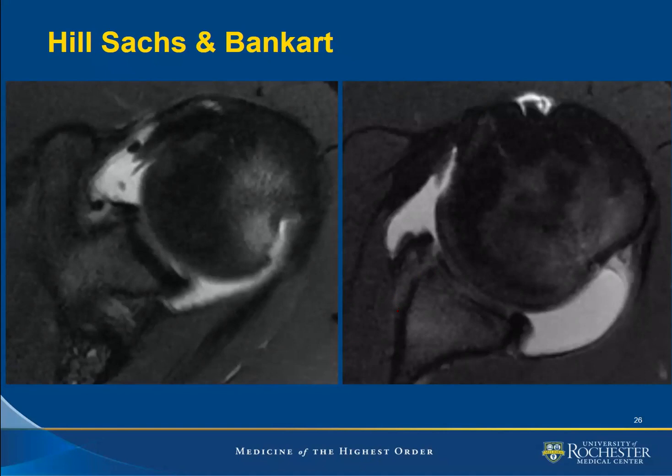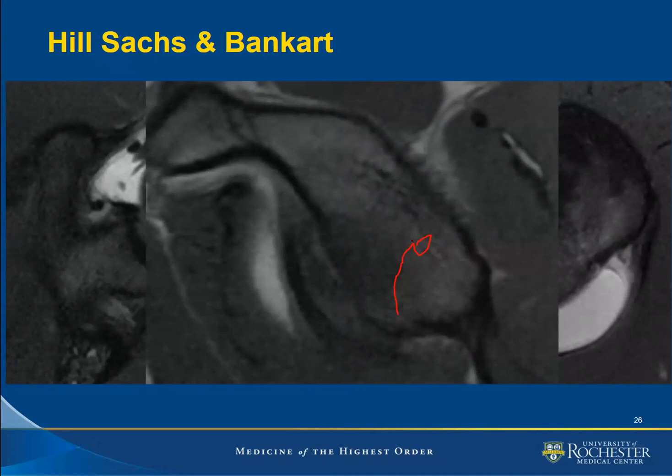And what's occurred here is we've had periosteal stripping. The labrum is completely displaced out here, and filled into this space is basically granulation tissue. So when you're looking at these MRI images, sometimes you'll see contrast imbibe itself between the periosteal stripping, or sometimes if these are more chronic, you'll get this granulation tissue. So my recommendation would be when you see these abnormalities to start getting a sagittal T1 or proton density image. On the sagittal proton density image, in this case, you can nicely see the bony Bankart abnormality, as well as the deficiency of the anterior inferior glenoid.